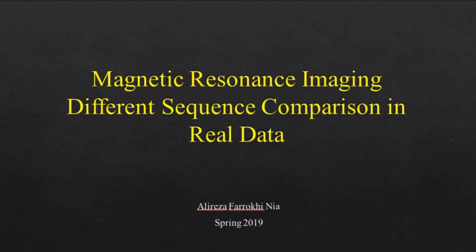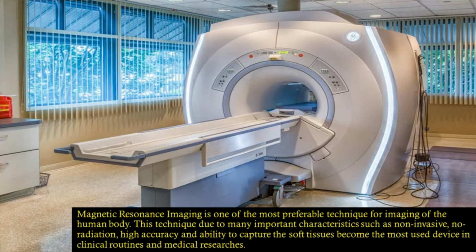Magnetic resonance imaging different sequence comparison in real data. Magnetic resonance imaging is one of the most preferable techniques for imaging of the human body.